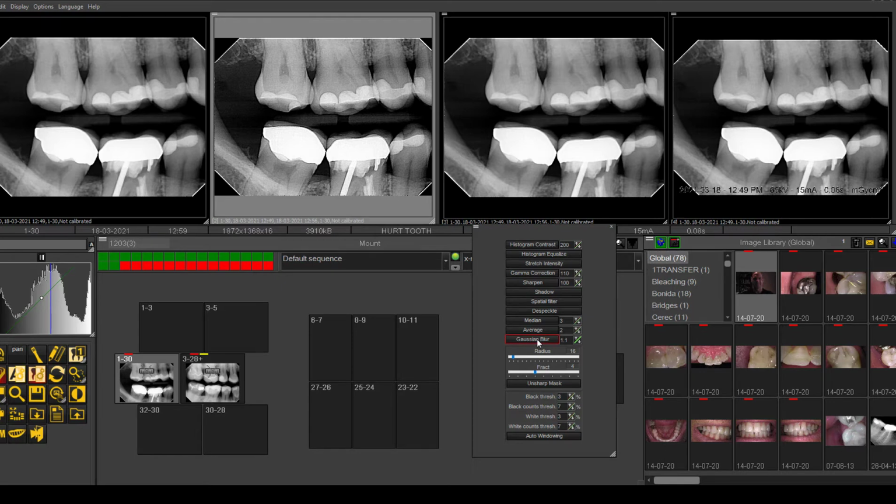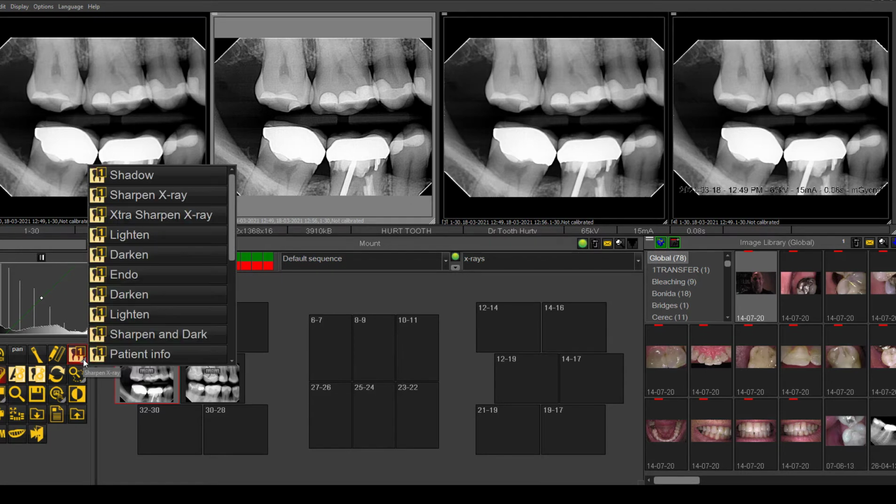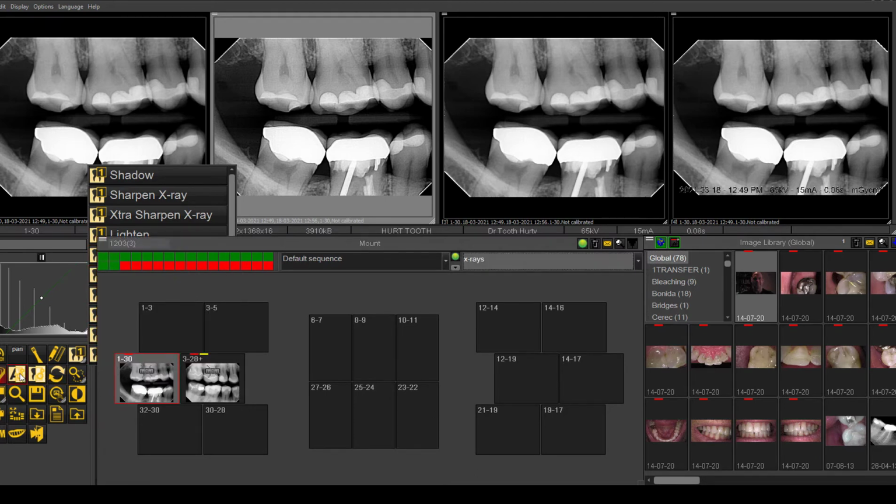There is Gaussian Blur, which can be used to smoothen or make it look a little bit less grainy. So you can have kind of a back and forth with the graininess. And there is an advanced video on these filters and how to use them. For this video, I'm just going to show you the very basic icon. That really is how we program each individual filter, with those parameters. And then we program that into our advanced all filters here, okay?